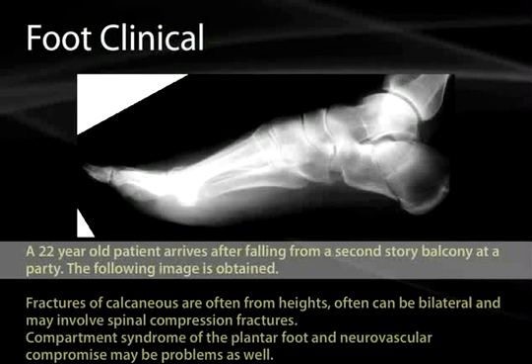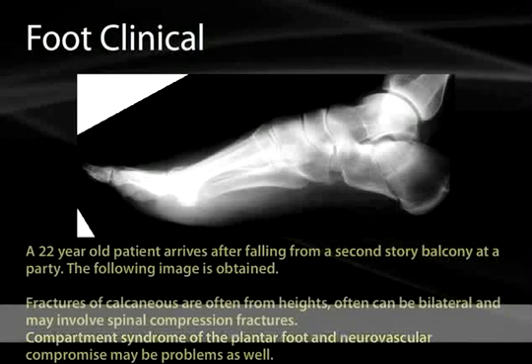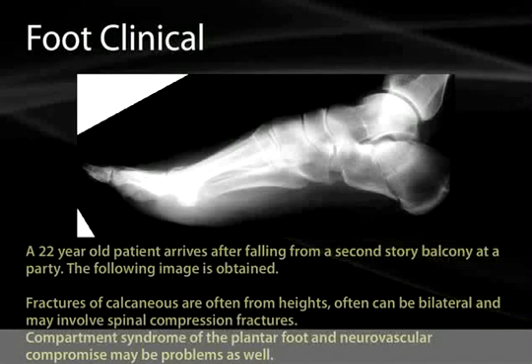When you look at the side, you can follow the posterior calcaneal line around the edge towards the anterior side, and you'll see an oblique crack coming up superiorly through the calcaneus. This is going to definitely have problems. They're often bilateral. And the important thing to notice when you find a calcaneal fracture is there may be or should be suspicion of a compression fracture in the vertebrae as well. Remember, we talked about those earlier and how many of them go undiagnosed. There can often be a foot compartment syndrome in association with these, and the neurovascular compromises that can become problems if it's undiagnosed or untreated.